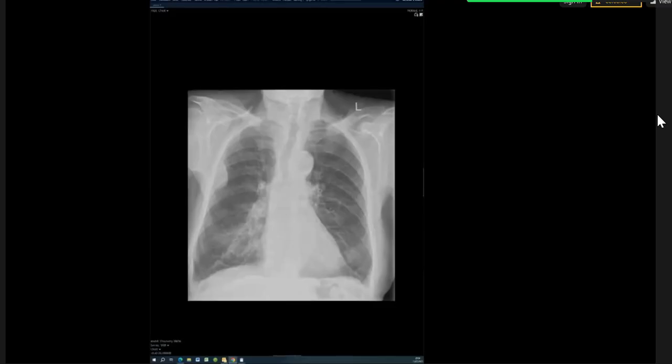Yes, it can be. How to differentiate between collapse and consolidation? That's a good question. Usually they both happen at the same time. So that's one way to get out of a tricky spot. If you can't make up your mind, something has to have consolidated before it collapsed. So it's quite common to see in reports there is collapse consolidation.